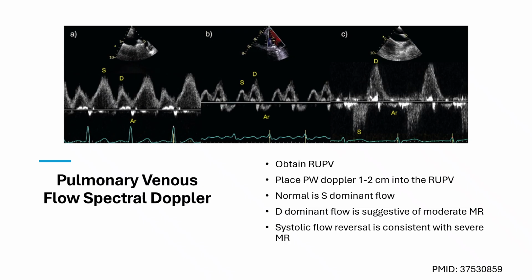It is important to remember that in certain cases of mitral regurgitation, you may have a normal pattern of pulmonary venous blood flow. This is typical for eccentric jets, which preferentially go into one pulmonary vein, which you may not be studying with this technique. So again, absence of systolic flow reversal does not necessarily rule out significant and severe mitral regurgitation, especially when using TTE, because with TTE you don't often have the luxury of visualizing all pulmonary veins. Please pause this video if you need more time to review this concept.